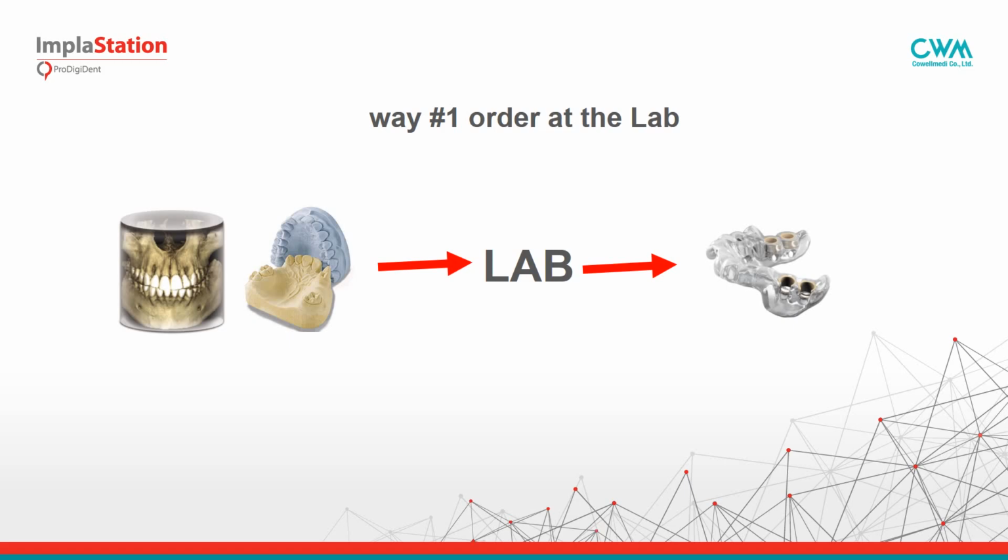All these steps may look quite complicated, but let me show you some simple ways to start working with surgical guides. The first way is very obvious. It's to provide initial information about the patient to the laboratory and receive the fully prepared surgical guide from the laboratory together with the drilling protocol.